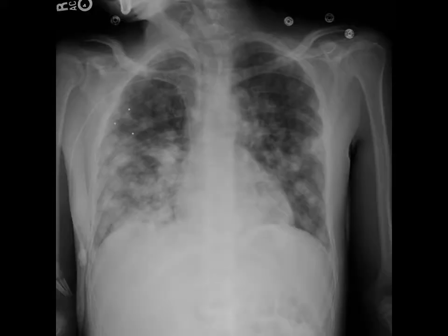This is a 22-year-old male admitted for metastatic testicular cancer. A PICC was placed, and later that day, or a few hours after placement, he began having PVCs. He did not have a history of PVCs.